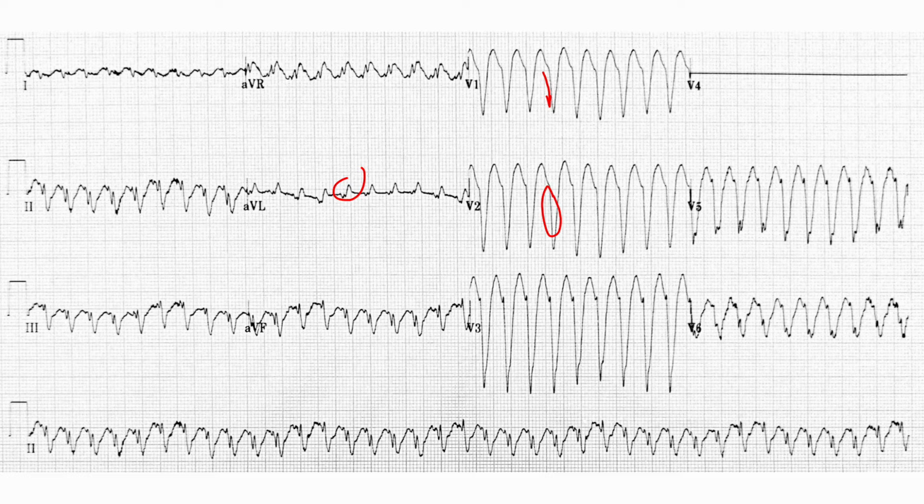Brugada has figured this part out and has actually included it in his algorithm. Even though we don't use the Brugada algorithm, I still think it's important to draw some wisdom from it, because Dr. Brugada has done the footwork to determine what's typical and atypical for a bundle branch block. Here I also see that little high frequency deflection, that little signal before each QRS.